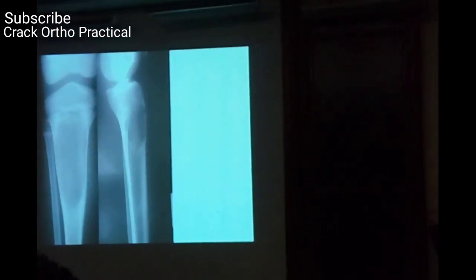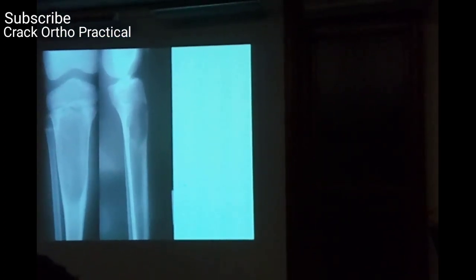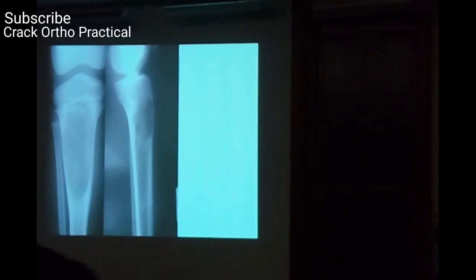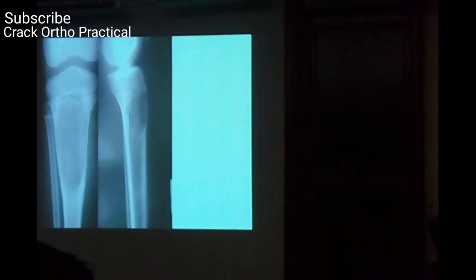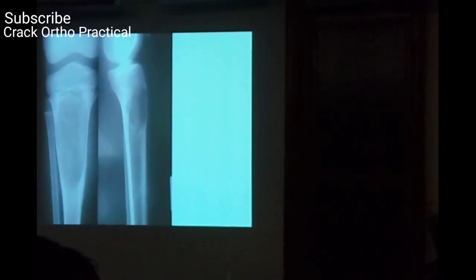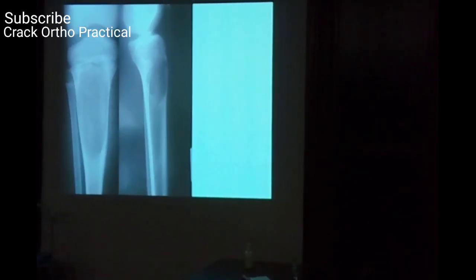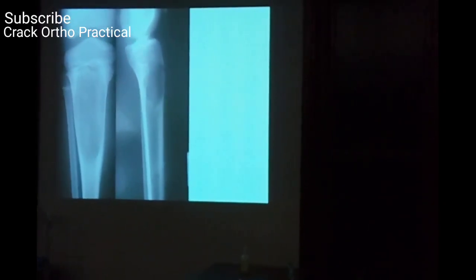Anybody for this? Pascal. Lateral view, plain X-ray of the knee, AP and lateral view.